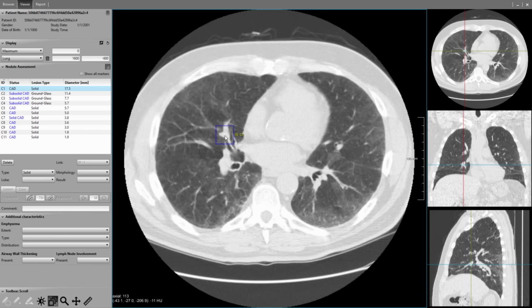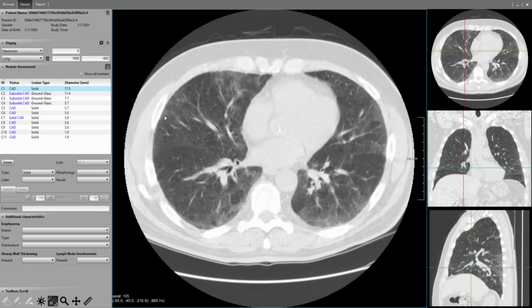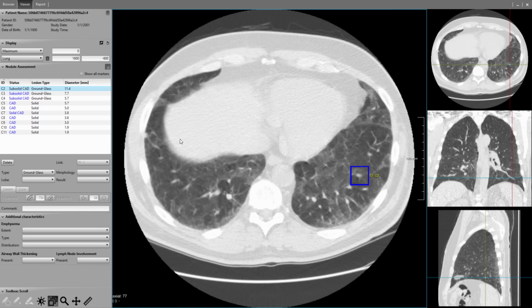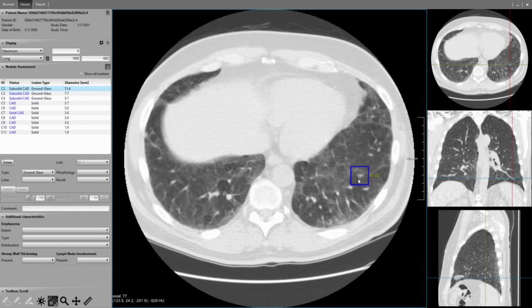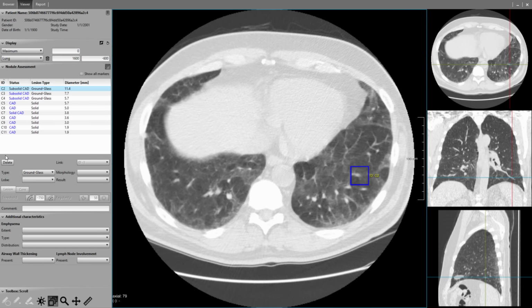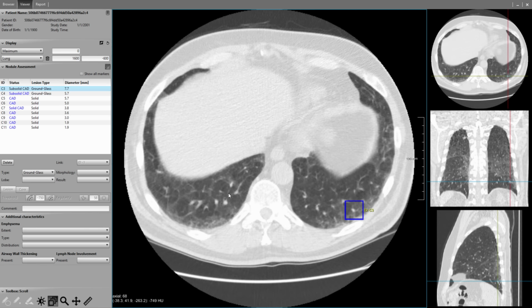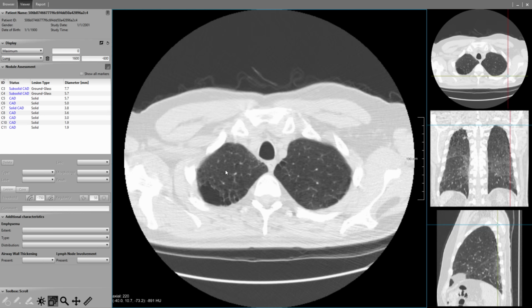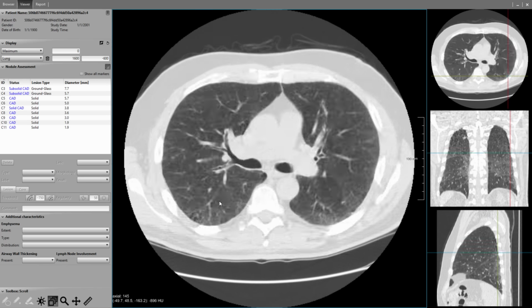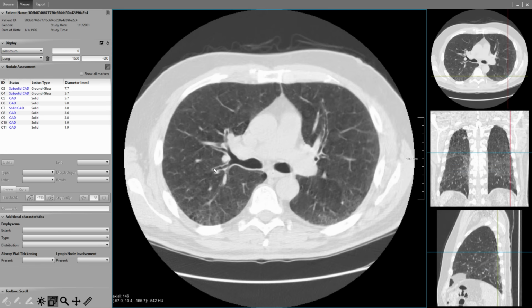I don't think this is a nodule. I think it's all vessels with a bit of motion. There's an airway next to it. I don't see a nodule. And the computer is a bit confused because of all the motion and the thick slice data. This is not ideal quality data. It's also nothing, just a vascular structure. As you can see, there's a lot of emphysema here again. In many of the non-cancer cases, no real suspicious lesions can be found.